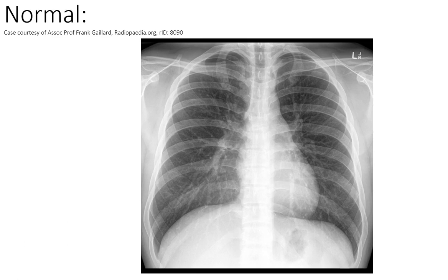However, the idea that the liver is pushing up on the diaphragm, I think that does need to be re-evaluated, because the liver is a really interesting organ, and when you cut a piece off of it, for example to do a transplant, then the lobe of the liver can often regenerate, and I think it just fills the anatomical space that it sits in under that hemidiaphragm.